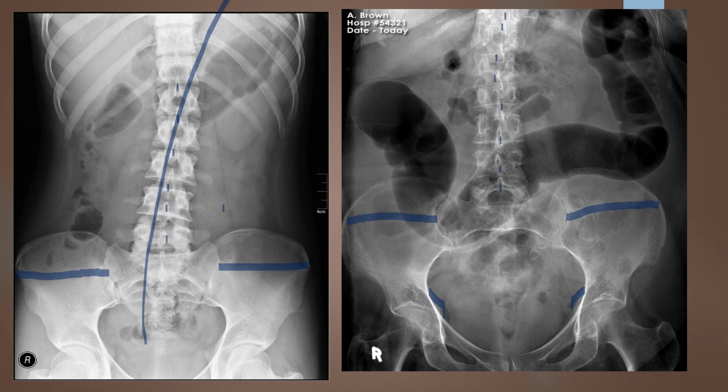You'll also see a couple little phleboliths down in the pelvis, but pretty decent exam. So I wouldn't repeat it unless I really felt I could get some improvement in that mid-coronal plane tilt. Mid-sagittal plane looks nice and aligned with the long axis of the IR, so I think we're good there.